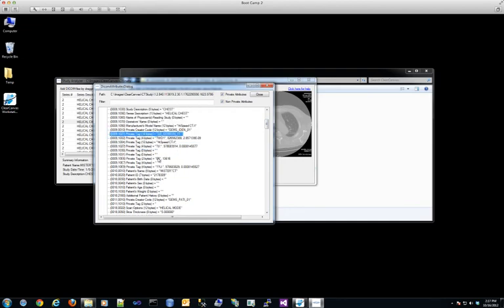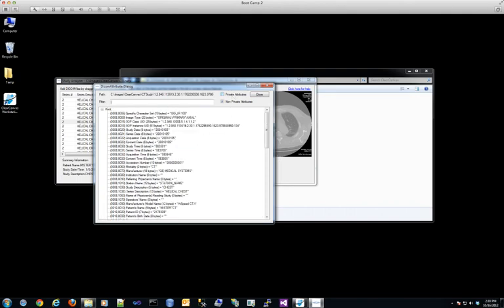Now in some cases we don't know the VR, that is the type of the value, and so it tries to guess the best it can, or display the attribute in different formats. In this case we don't know; it's a 4-byte attribute. We don't know if it's an int, like a double word, a single precision floating point number, or a string. So it displays that value in all 3 different types to help you understand what's there. I'm going to toggle off private attributes and show another feature.